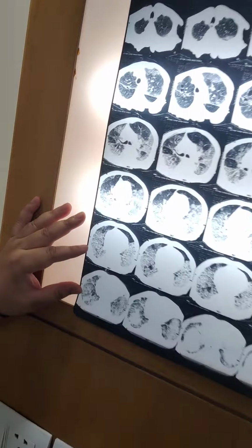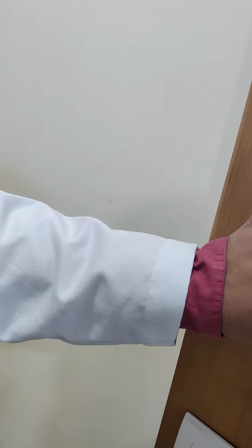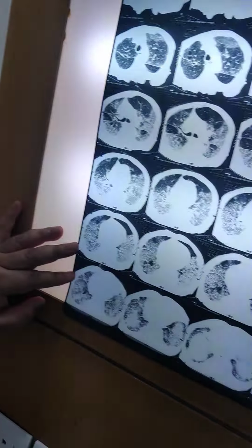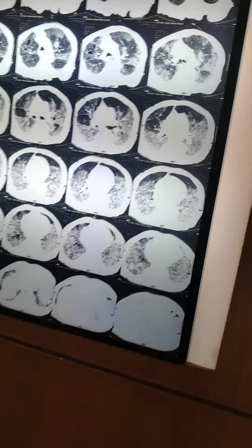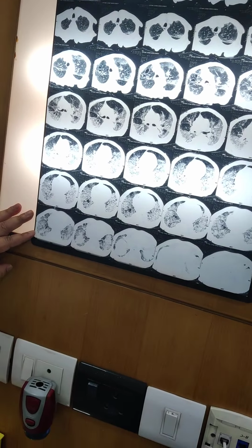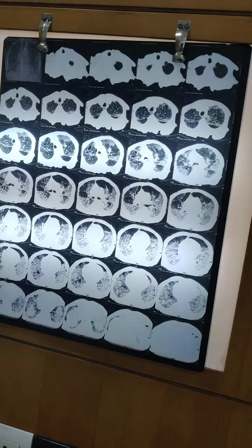And also, if you could see here, there are some vascular dilatations here. You see, can you see some vascular dilatations here? I could see. Now whenever you see vascular, these are the vascular. So in between those ground glass, you see these black shadows. These are vascular dilatations. So vascular dilatation, traction bronchiectasis, pleural effusion, lymphadenopathies, but the hallmark is ground glass appearance.